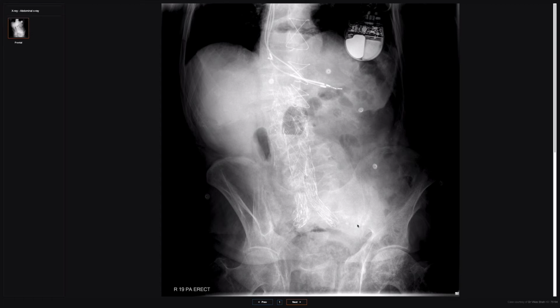Another specific use of abdominal radiographs is to look at abdominal vascular stents. Okay, so aortic and iliac stents. You can see here this person's had an EVAR. They've got these stents placed, and there'll be a regular follow-up regimen for these patients to check whether there's been perhaps migration or some kind of fracturing of the arms of the stent. And then you'll also see other devices within the thorax, such as pacing devices and pacing wires and sternotomy wires as well.